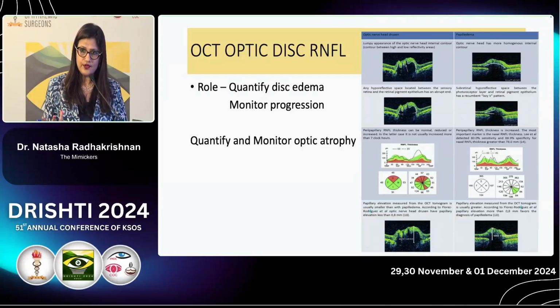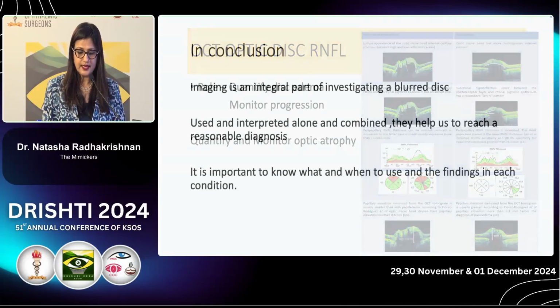So the importance of optic disc RNFL values comes in monitoring more than diagnosis. One is quantifying the disc edema in the beginning, and then you can monitor progression of the disc edema or progression into optic atrophy using your optic disc RNFL.